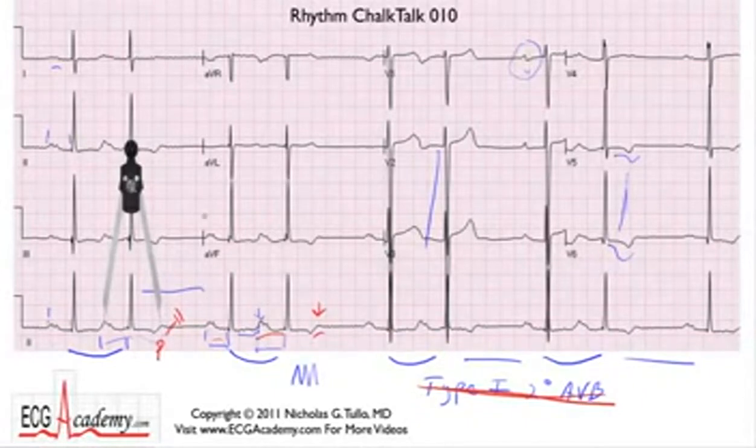Well, I'll tell you what this is. This is a sinus beat, and this is a sinus beat. And if you figure out what's in between, the next sinus beat should have fallen here, but it didn't. It came here. Okay, so it's not a sinus beat. It's premature. So this is a PAC. It's an atrial premature beat that landed on the T wave. It conducted with a first-degree AV block much longer than the underlying first-degree AV block.